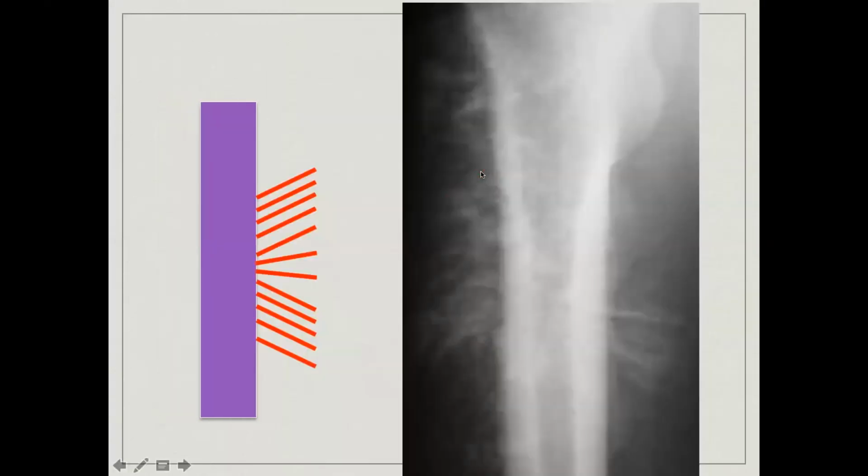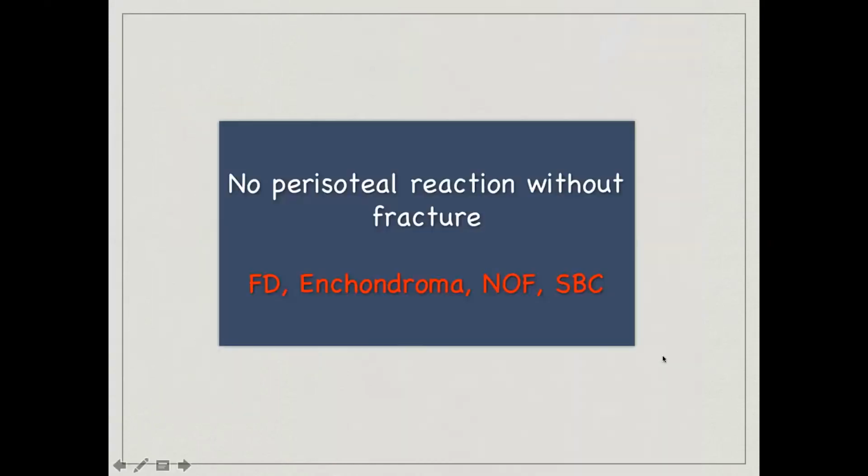So all these types of periosteal reaction, and lastly the sunburst one, which is really aggressive. So it is growing against the bone and growing in a different direction. So this suggests a very aggressive lesion, right? So these are the two important steps which help you come down to a diagnosis of aggressive versus non-aggressive.